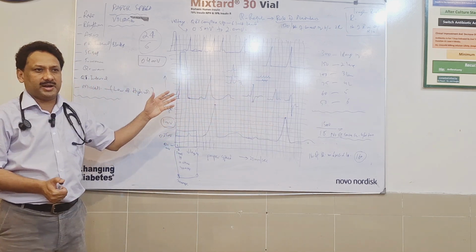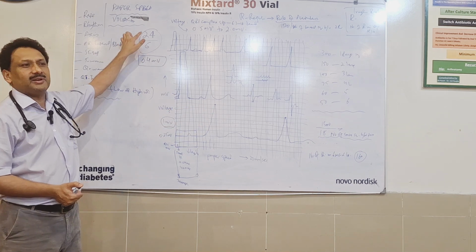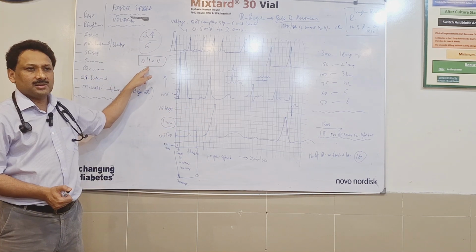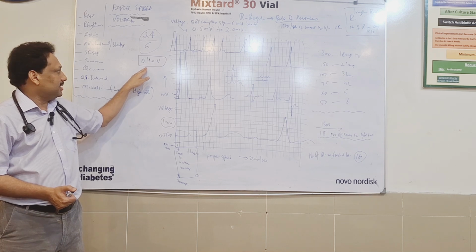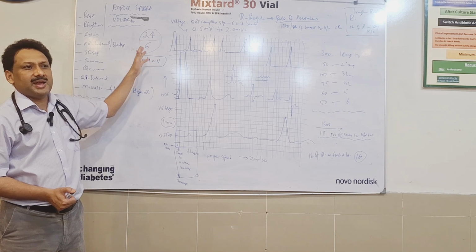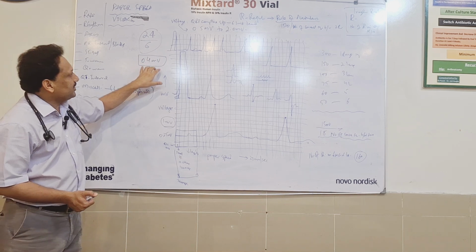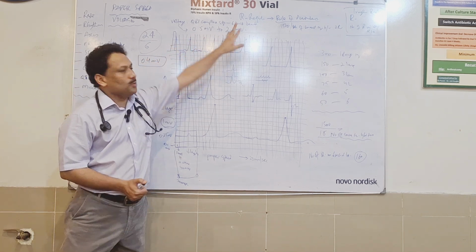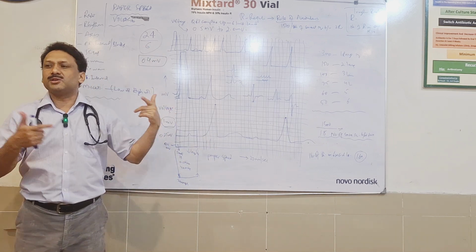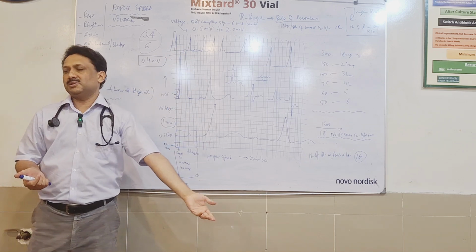You just keep on counting it. Add all the QRS complexes. Whatever the result is, divide it by 6. And whatever the result comes to, mark the result. So here it was 4, so make it 0.4. If it was 5, we would have made it 0.5. If this is 0.5 millivolt to 2 millivolt, this is normal voltage. If this is less than that, this is low voltage ECG. If this is more than that, this is high voltage ECG.